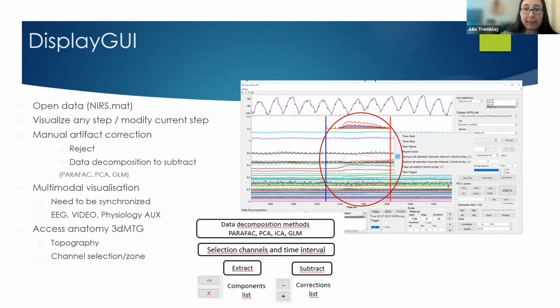If you have the opportunity to record data such as video, EEG, or external physiological measurements, you may integrate those in your data. However, to integrate multimodal data, you must ensure to synchronize them with NIRx by using a common trigger at the acquisition and segment this marker in your pipeline. It is also a good practice to test the synchronicity. If you use them over a long period of time, a time lag could appear, so it could be a good idea to use several markers to detect time lag and do your validation.